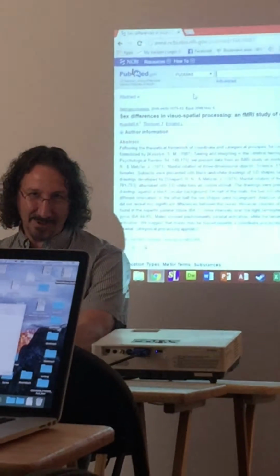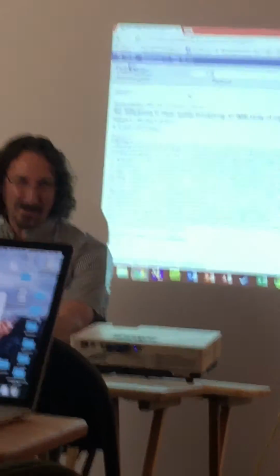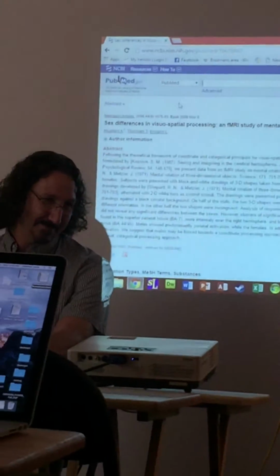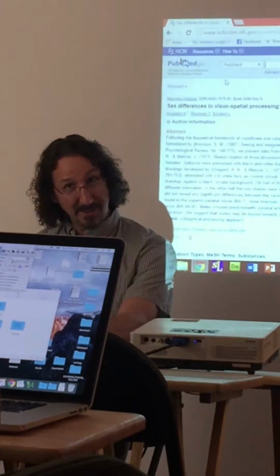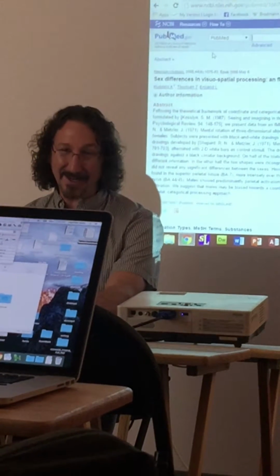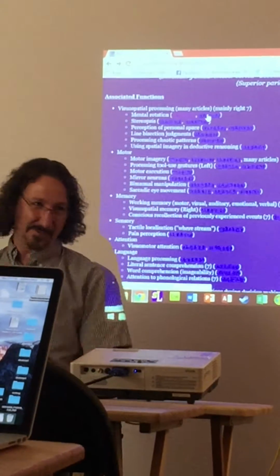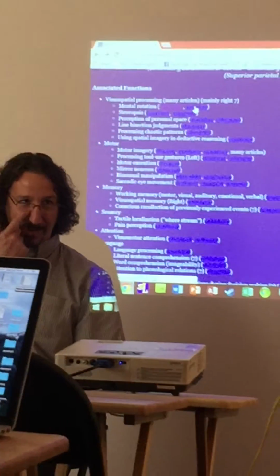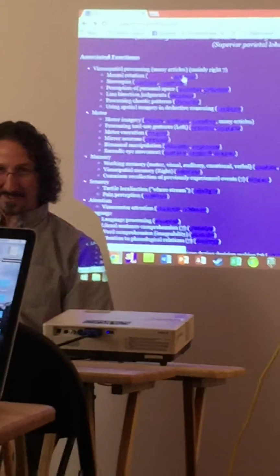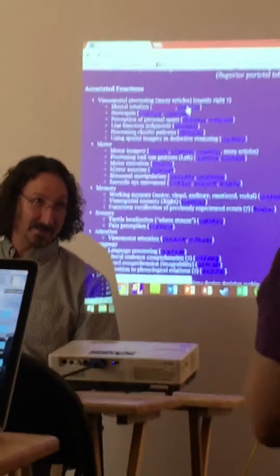This is invaluable. So you can go through and start reading about how they came up with this opinion, right? You may agree, you may not agree, but still, it's pretty compelling, and there's a boatload of data here. Sometimes when I'm on long flights and they have Wi-Fi, I'll bring this up and start going through one at a time, reading the abstracts. It's amazing what you'll find sometimes.